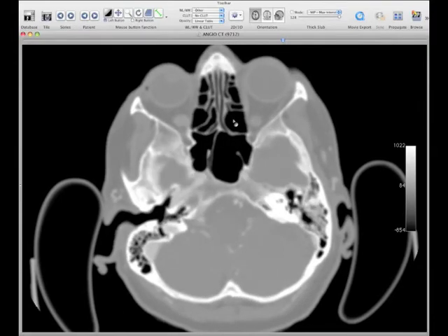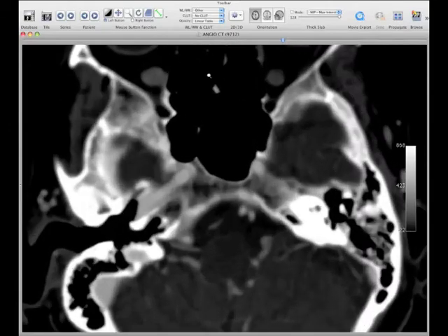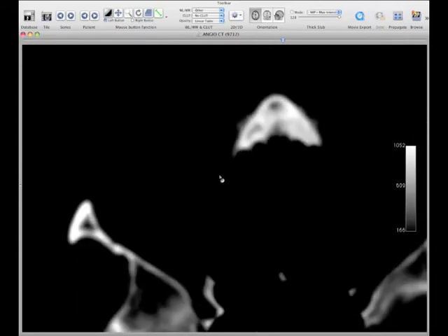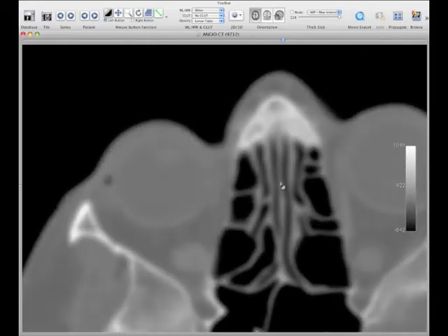And what this allows us to do is pretty interesting. If we wanted to, I'm zooming and scrolling using these functions here. So this is move, scroll, rotate, and this does window leveling. Window leveling, if you click up and down, left and right, it adjusts the grayscale values. These are all 16-bit images and have very good grayscale values.